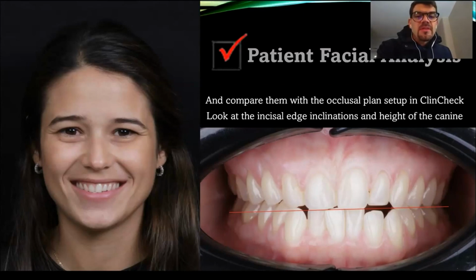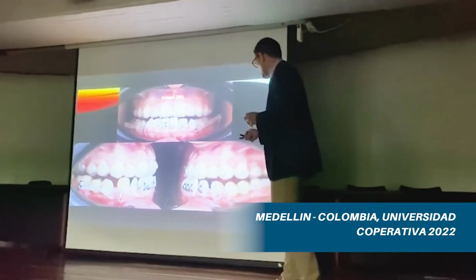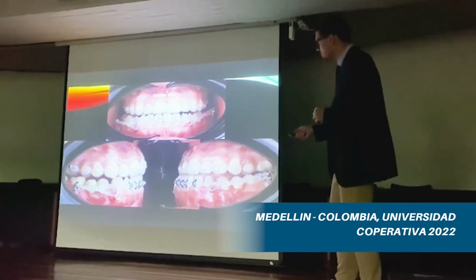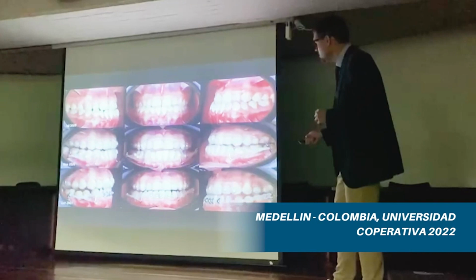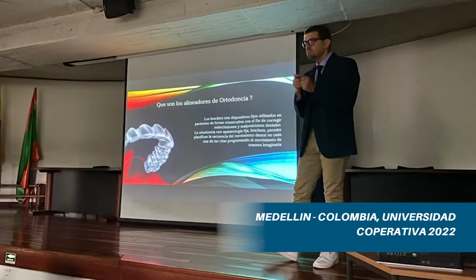Look at the incisal edge inclination and that of the canine. I recommend for the above view the overlay and grid tool.